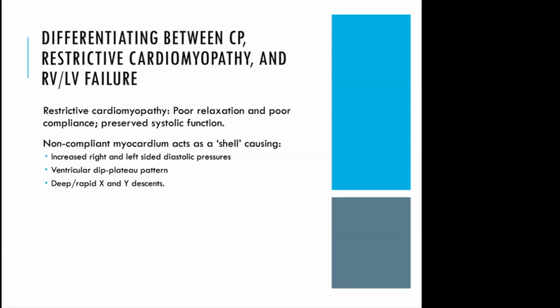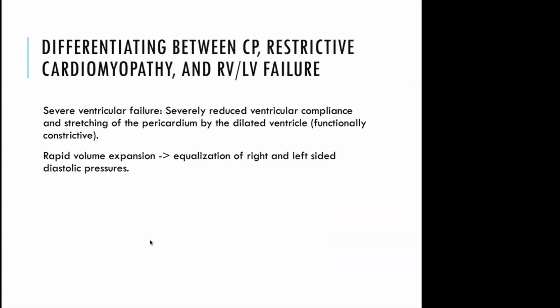The ventricular dip and plateau pattern that we talked about, which relates to the early filling and early halt of filling due to the pericardial constraints, and then the deep and rapid X and Y descents, that's, again, namely for constrictive pericarditis.